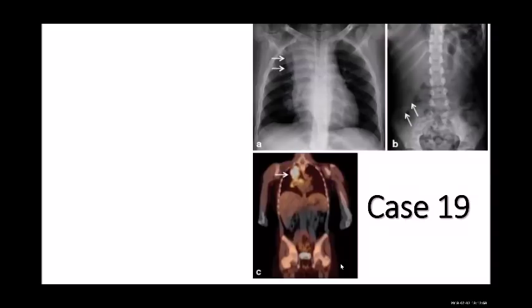Homogeneous opacity in the upper lobe of the right lung. There is a wide mediastinum. There is widening of the mediastinum. There is something wrong with the mediastinum, I agree, but I think it's mainly because of this. Yes, shifting, and it appears very clear here. And there is a jet black lower lobe.